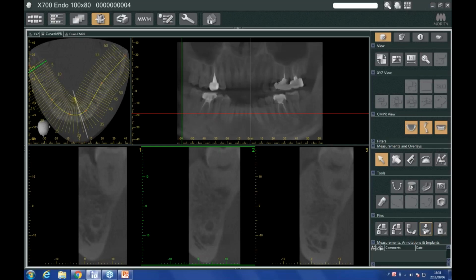So of course I can go back down to this button as I did before and click on current state. But in this case, I'm not so interested in the name. So on my keyboard, I'm just going to press Control S. That's a quick shortcut for save. And you can see saving to database. And now it'll be available next time I need it.